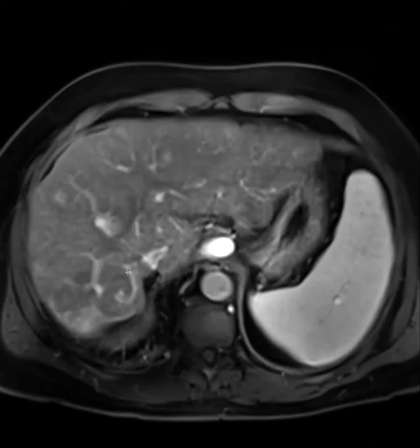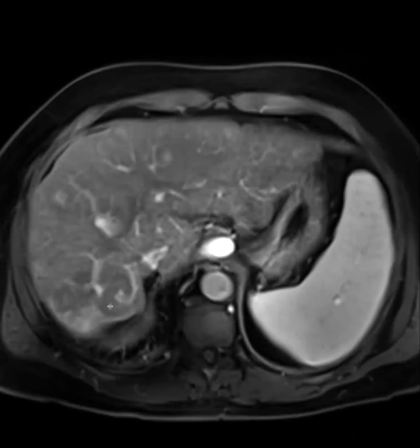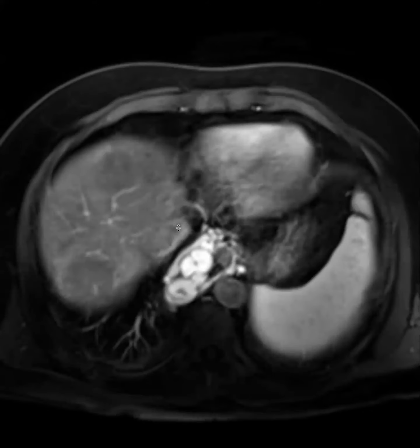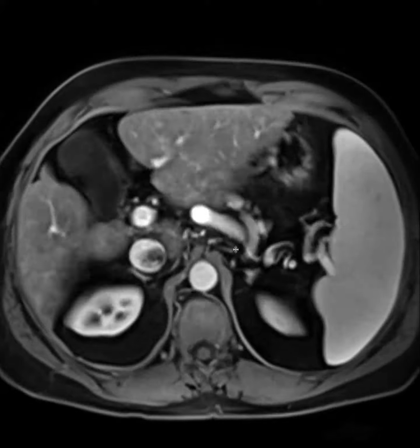Here, this is a vessel. There's maybe this one, and maybe even smaller vessels going through other parts of it. I really do like this for peliosis. And then the question is, what's their history? It looks like they have chronic liver disease. So they do. They have cryptogenic cirrhosis.